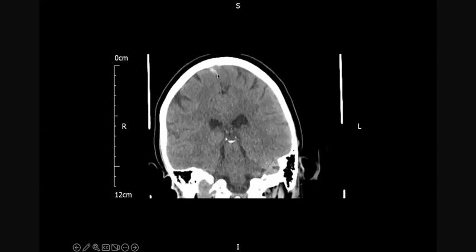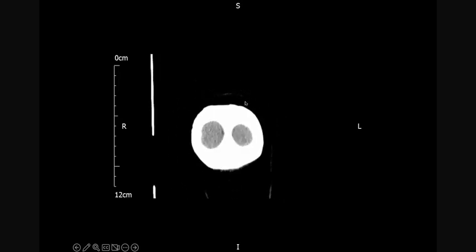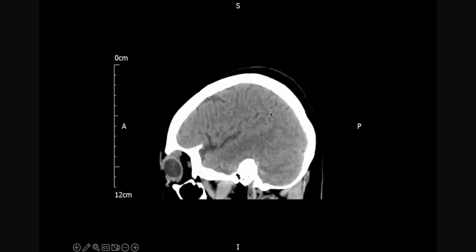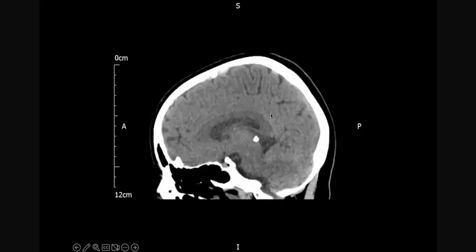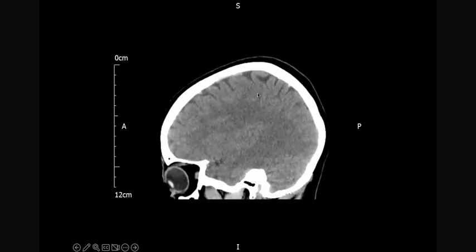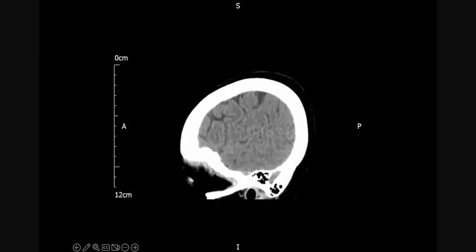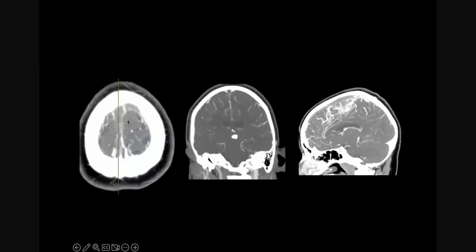And you will see the effects of this on an MR. And this patient, by the way, presented with stroke-like symptoms. So this is the superior sagittal sinus, and some of these veins where I'm pointing out are thrombosed. So we did an MR. Initially a CT venogram. On CT venogram, you can see this filling defect in superior sagittal sinus.